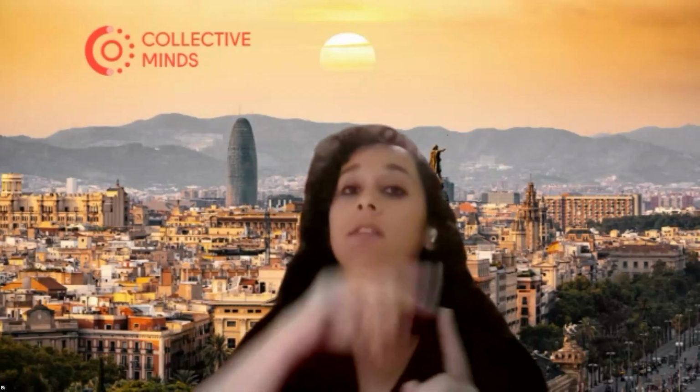So what you have to do is, as we saw with Maria, you configure it once, you put the information you know you want from this subject, and then after you run it, you already have the report for this specific subject with the information that you chose and that reaches the people that you want. Instead of going through creating a result, then filtering by subject, then creating a report, then associating the results. So it's a workflow that users were already making, but we can now send in a much easier way.